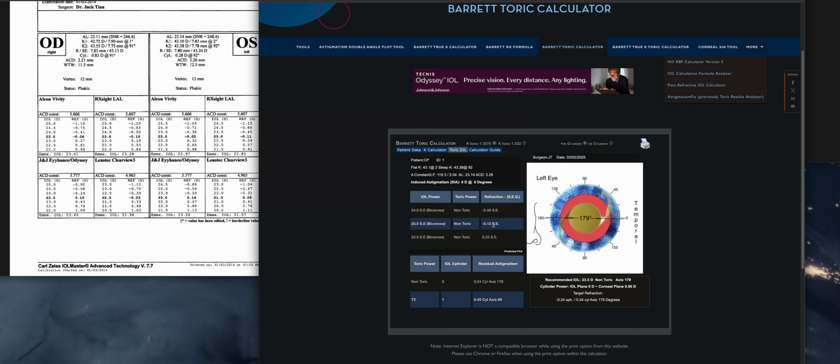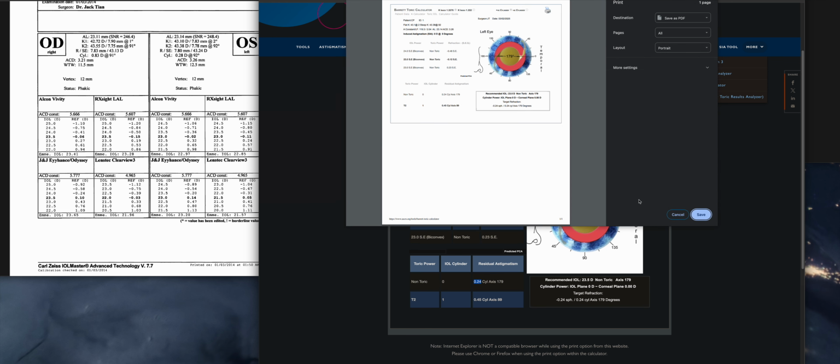All right, so for this eye, yeah, I think the 23.5 looks good too. So in this case, it's picking the same power lens both times. And then again, I wouldn't use the T2, even if I had it in America. I'd use the non-toric. Some people say with the rule up to about 0.5 diopters is nice and enhances the reading ability. No, I don't. I think you just want the cylinder as close to zero as possible. I would go with this one, even if it's against the rules. So non-toric, of course, 23.5. Let's save this one. I think this is our fourth eye.